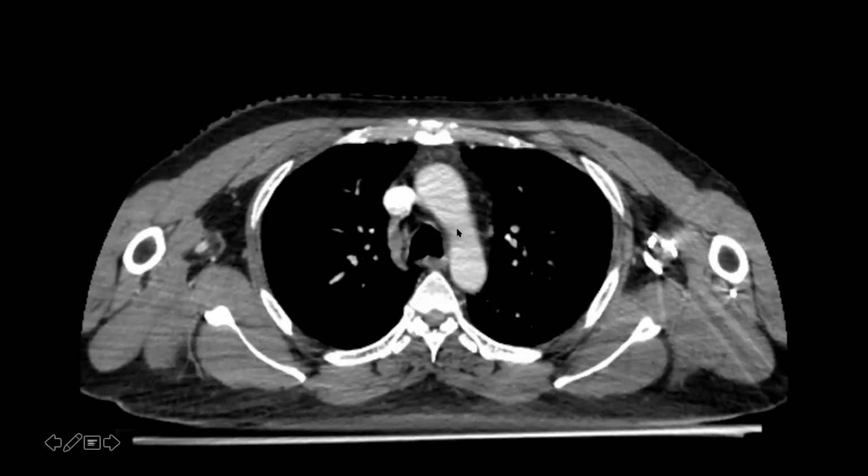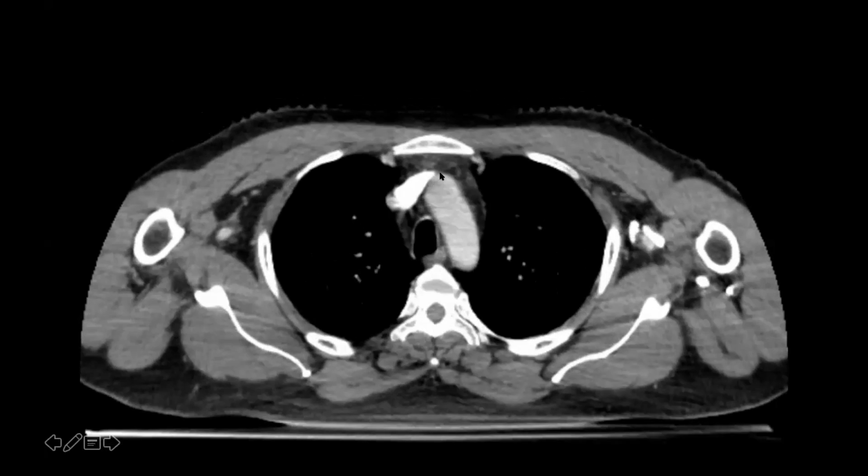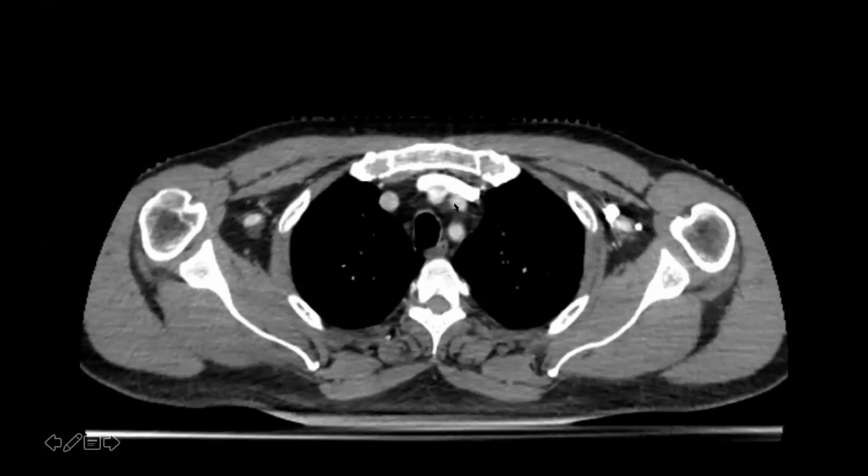You can go to the left ventricle, see the ascending aorta come out of it, and then see the arch of the aorta. So we saw that the arch of the aorta gives three branches. These are the three branches of the arch of the aorta, 1, 2, and 3. This here is the brachiocephalic trunk. This here is the left common carotid, and this here is the left subclavian.